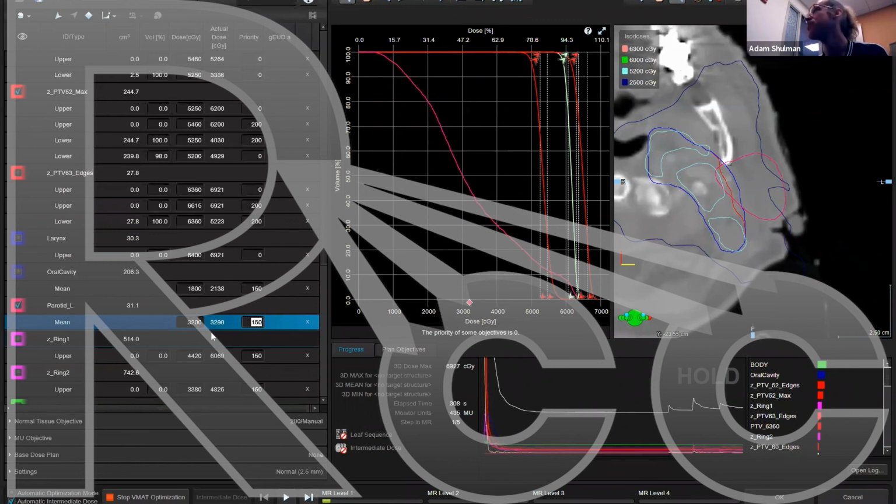So that's just a key point. You do this for all of your organs at risk. You'll keep dropping by about 4 gray until you get about 1.5 gray away. That means you've pushed it far enough. You always leave it at 150, targets at 200.